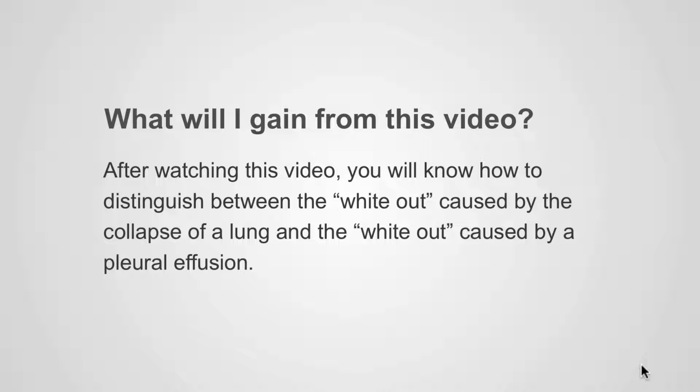What will I gain from this video? After watching this video, you will know how to distinguish between the whiteout caused by the collapse of a lung and the whiteout caused by a pleural effusion.